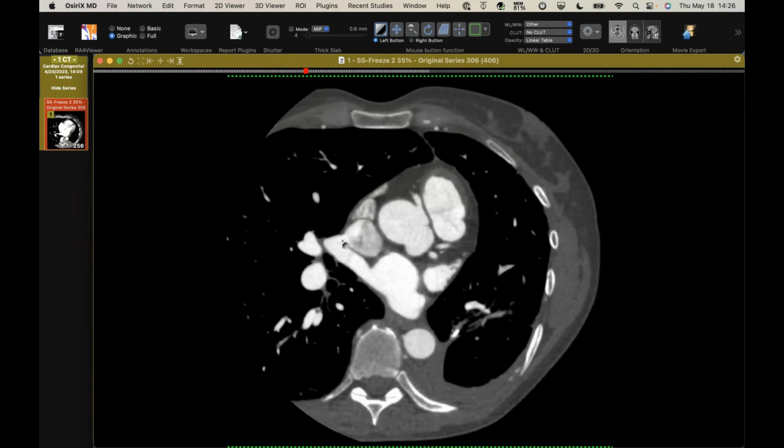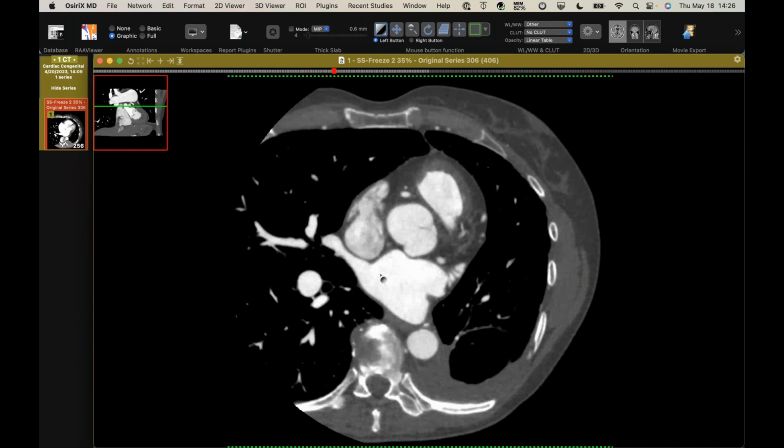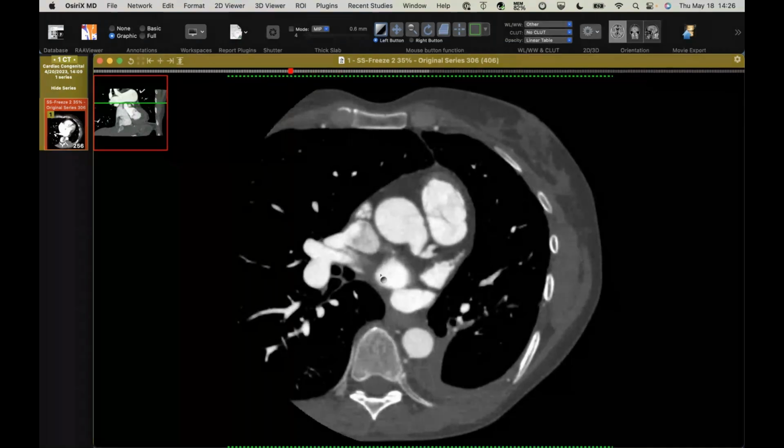I'm not sure, David, if you've ever come across it, but I would just classify it as a variant sinus venosus ASD with partial anomalous venous drainage. It's very cool. I've not seen it before. And actually, they repaired this. They just ligated this, and that solved the problem. There were some other issues with it as well, but you can see everything else.